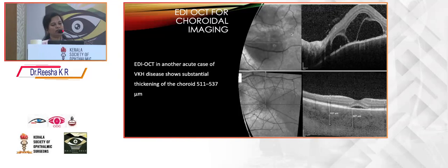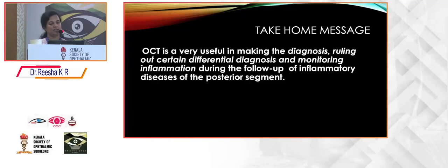EDI helps in identifying the response to treatment. The measure of enhanced depth imaging helps in response to treatment. The choroidal thickness reduces in size as the lesion responds. So OCT is a very useful marker in diagnosing, ruling out certain differential diagnoses and monitoring inflammation during the follow-up of posterior uveitis.